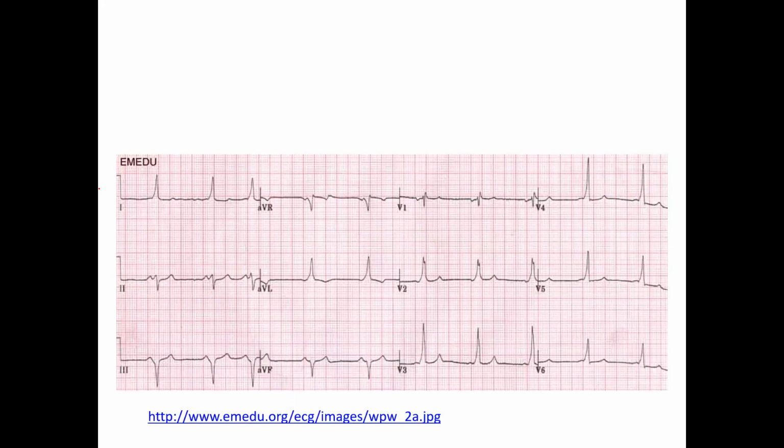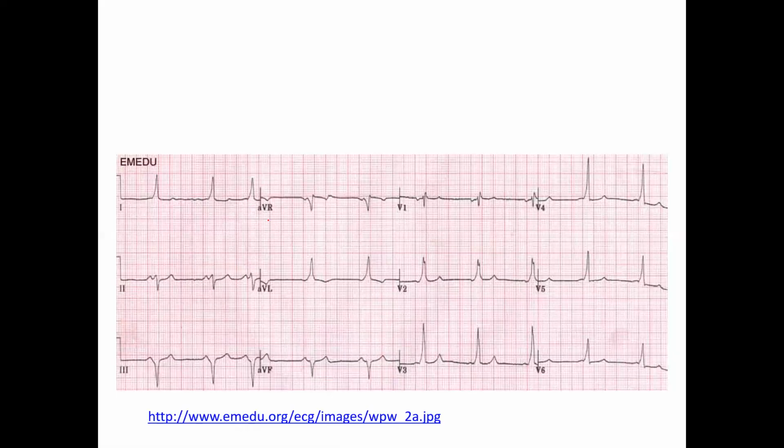Professor, I have a question about... You kind of have to be careful with this one. Sorry, I'll get to you. When you look at this particular picture, this is not a spike. This is just separating the leads, the 12 leads, you see? That's not a spike, you understand?